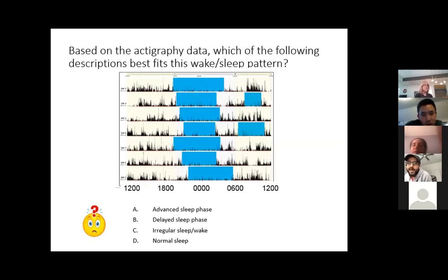Based on the actigraphy data, which of the following descriptions best fits this sleep-wake pattern? Okay, everybody? Irregular? Regular. Come on, guys. I'll say advanced. No, because they're starting to shift on a daily basis too.